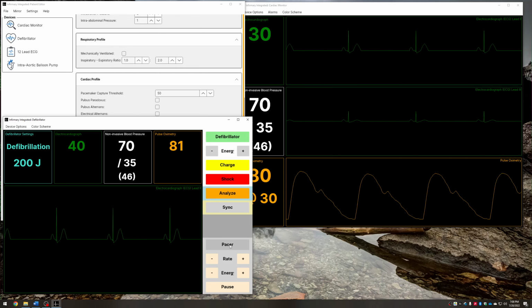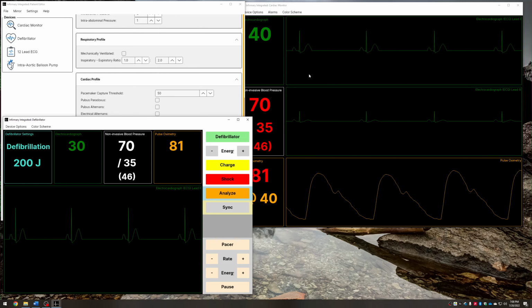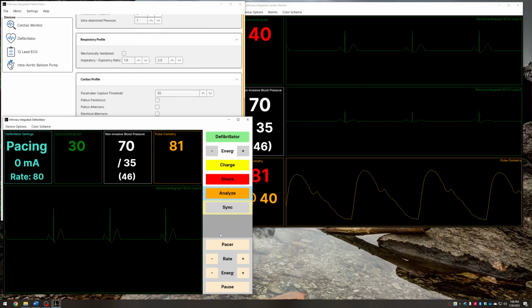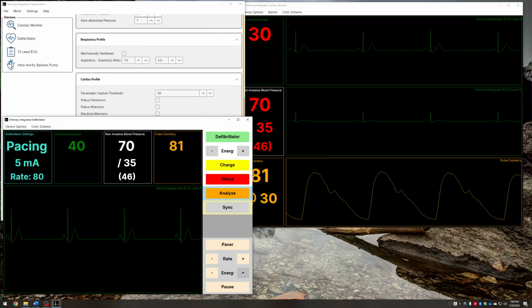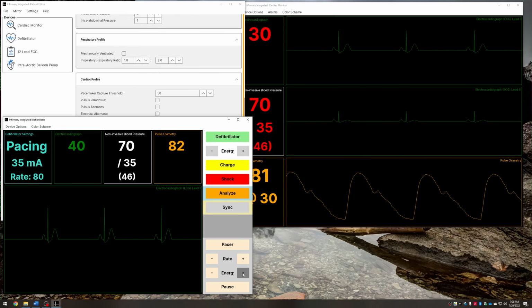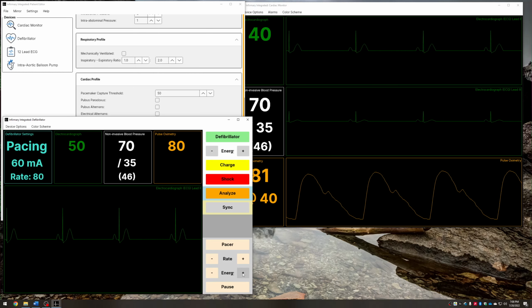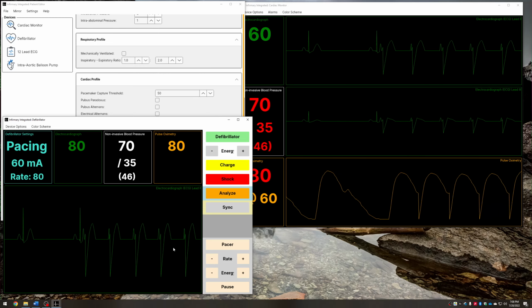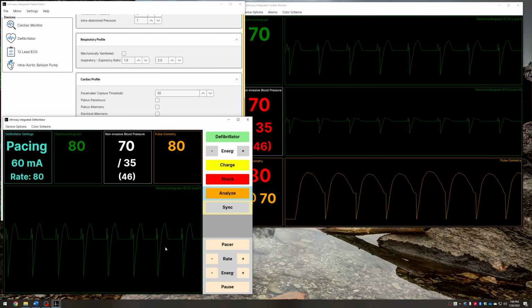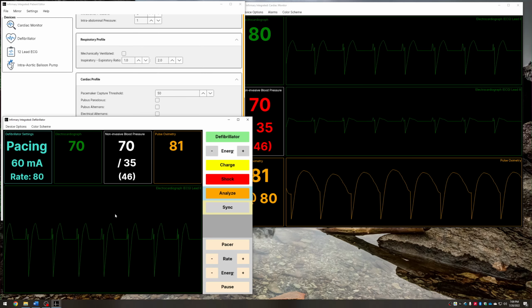Now, as I mentioned earlier, these devices are showing an actual patient simulation. So as I put the pacer on, it's set to a rate of 80, and I start to increase the milliamperage energy that we're going to deliver, and I've increased it past a certain threshold. We're going to start to see spikes, and we actually start to see the pacemaker capturing as well. Of course, that initial spike would unfortunately have been an R on T.